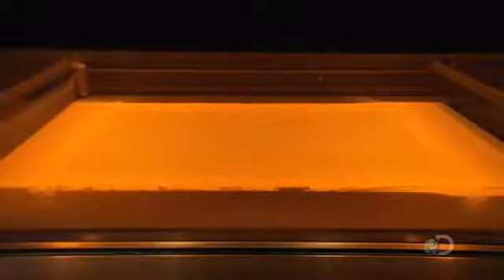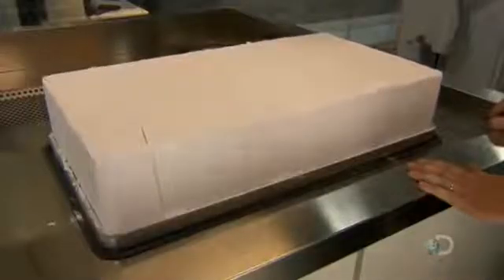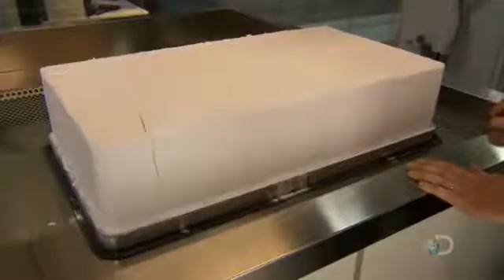The 3D printer applies a layer of powdered plastic, then, following the computer model, solidifies select areas with a laser. This process keeps repeating, building up the shape of these surgical templates layer by layer. One printer run produces personalized templates for up to 50 patients at a time, so the laser inscribes the patient's name and identification code on each part.